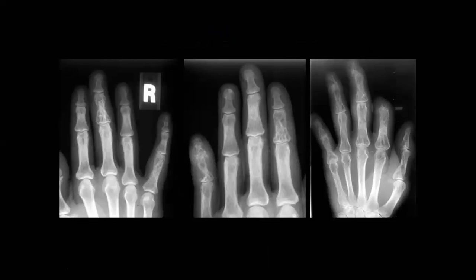So let's have a look at this appearance and what it could be. Okay, so when you find this, you will put, as we mentioned, a differential diagnosis, including sarcoidosis, one of the good differentials. But I see that our colleagues are all talking about just sarcoidosis.